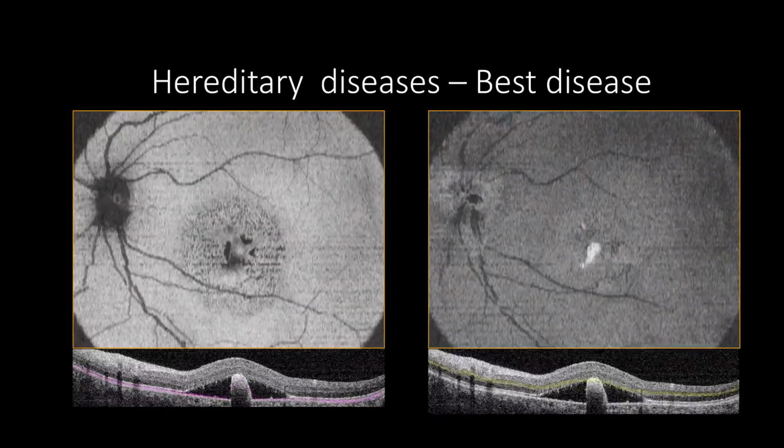In fibrotic cases, the RPE slab will show a central hyperreflective lesion inside a hyporeflective pocket associated with segmentation artifact in choroidal and IPL slabs. Please note the motion artifact.